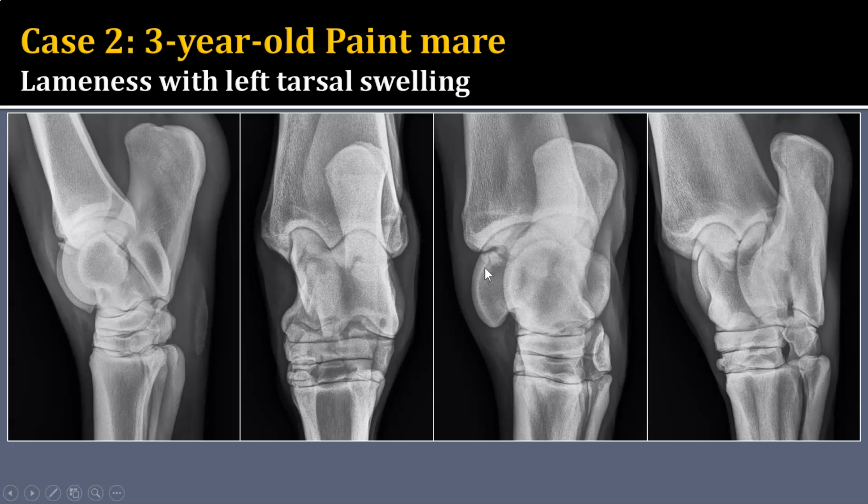Adjacent or nearby these fragments, I see that this structure, which is the intermediate ridge of the tibial cochlea, has a focal concave defect. And if you've forgotten what that looks like, go back and look at a normal. And then surrounding that defect is subchondral sclerosis. I probably am seeing the fragments sitting here on my DLPM view, but they're not as clearly identified.